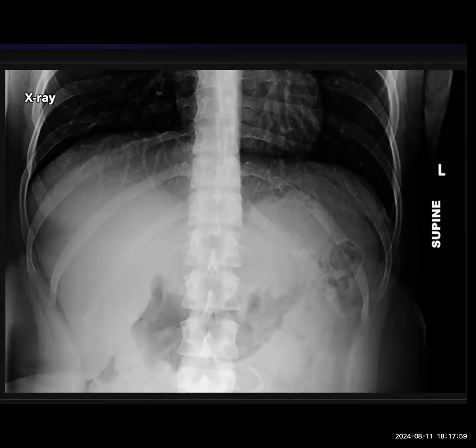The patient is supine in position. There is something that I want you to pick up. There's something else that you've not picked up yet. There's some soft tissue noted in the right lower side of the film. You can ignore that.